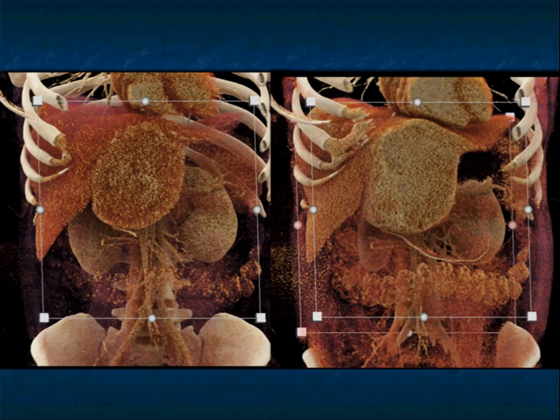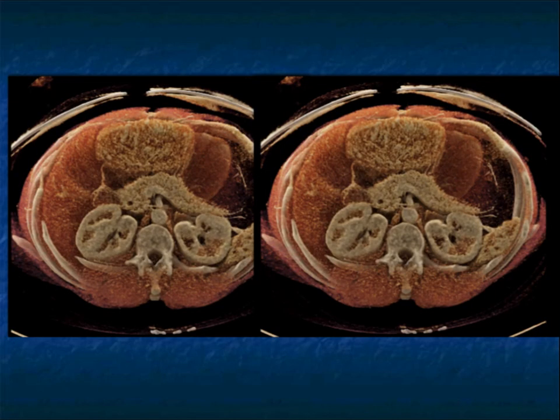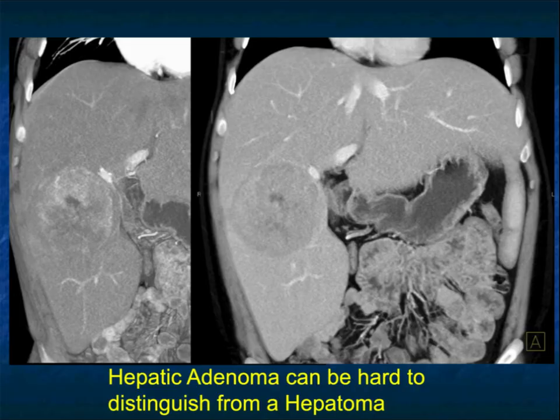Interestingly, on cinematic rendering, and we showed with cinematic rendering, texture mapping can show lesions well. Very nicely shows you the differential texture of this mass. Very nicely shows you the separation of the mass from the normal liver. And also that textural change, really good for cirrhosis.